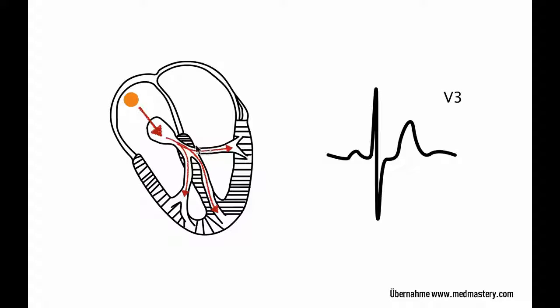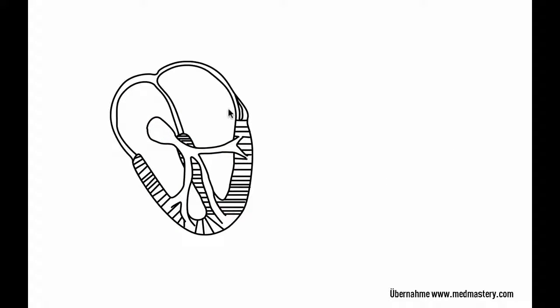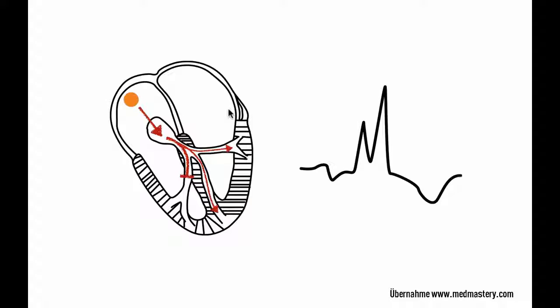Ventricular depolarization happens fast, and therefore the QRS complex is narrow. Let's look at a slightly different example. If the impulse takes its origin in the atria, enters the ventricles through the AV node, but finds one of the bundle branches blocked, as in this example, the QRS complex will show a bundle branch block morphology and will therefore be broadened. It will be 0.12 seconds in duration or longer. This example shows a right bundle branch block and what the ECG would look like.